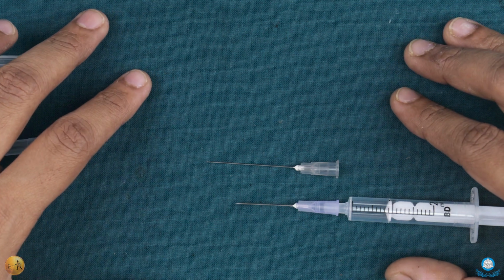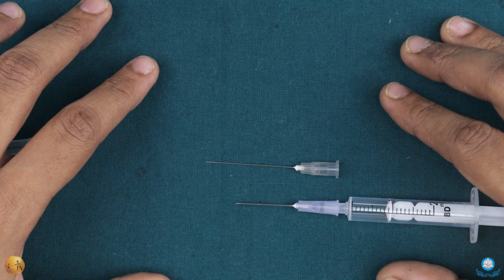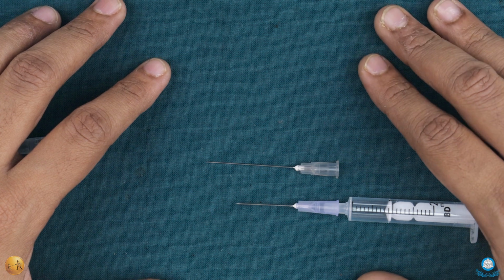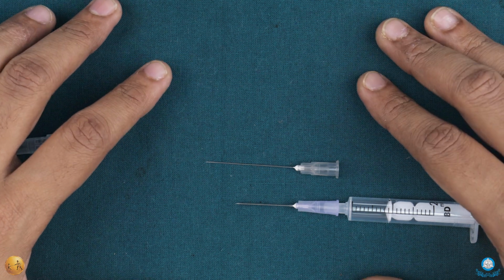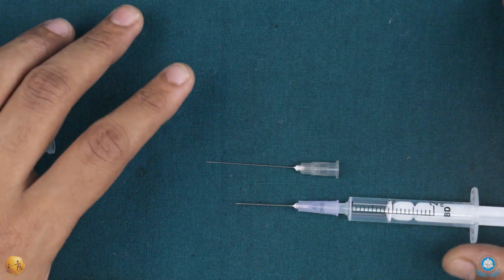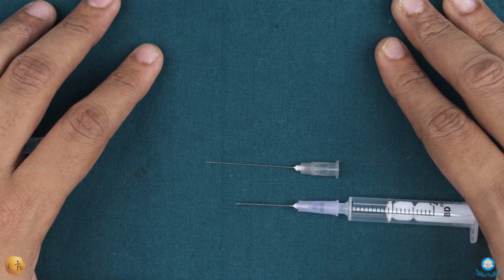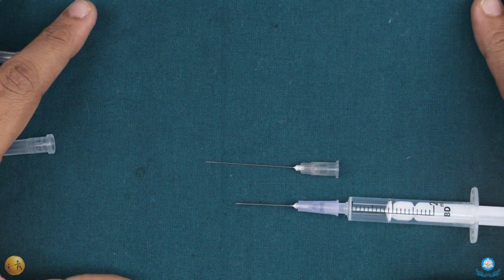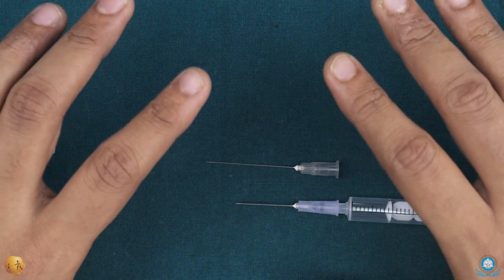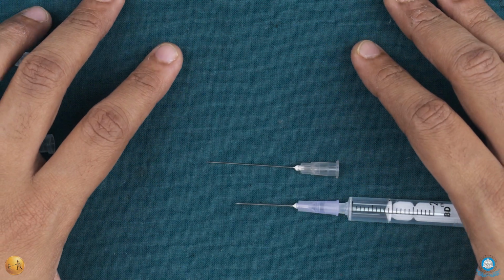Also, there is another parameter in this study which says that a 30 gauge needle gives you a positive aspiration rate of only about 2%. Okay. Now, whereas other studies have also proven that whether it is a 23 gauge or a 30 gauge needle, the rate of aspiration generally does not differ as much. There are two contrasting views on this, but kindly remember that the larger gauge needle gives you the better chance of getting a true positive aspirate in case you are inside a blood vessel.